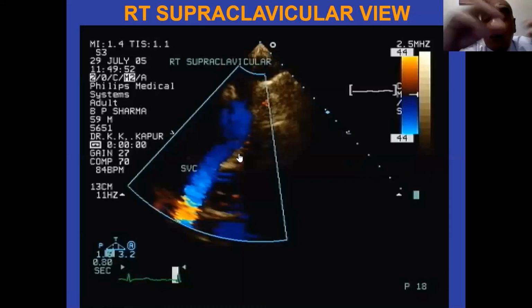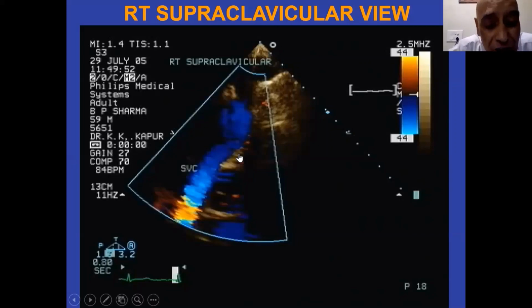The left ventricle endocardium outline is seen, and if there is no clot, then you know that you're dealing with an artifact and there is no clot at all. So contrast echo becomes very useful sometimes to delineate that. Any other structures that you want to look for, or is that enough?